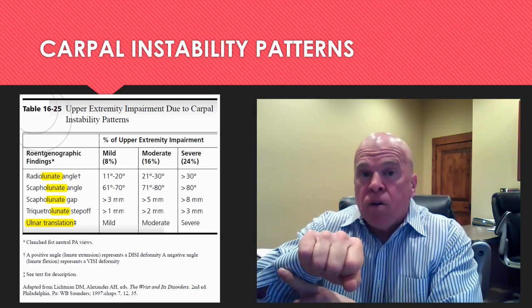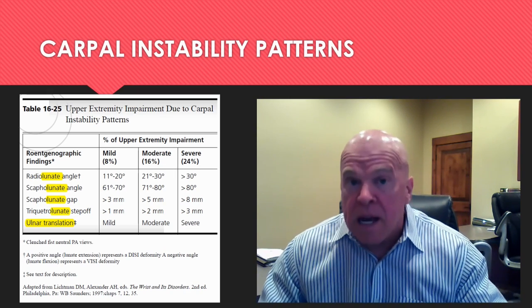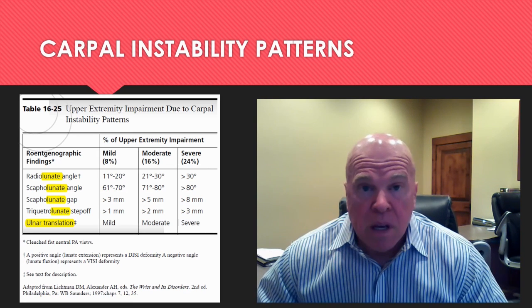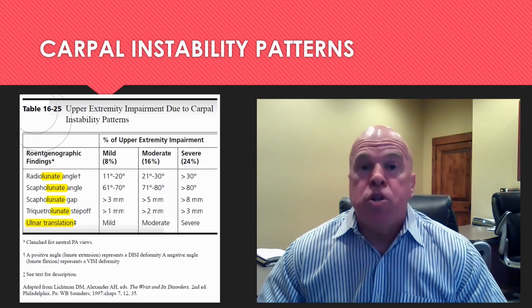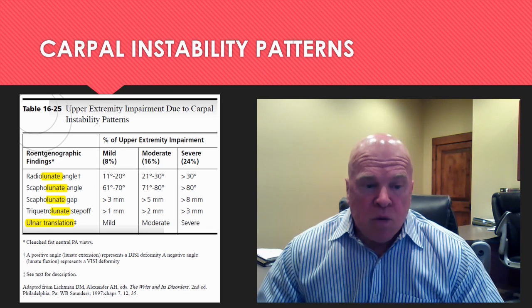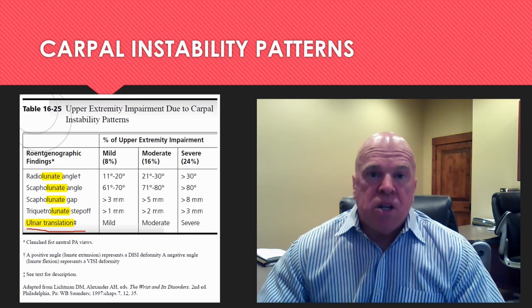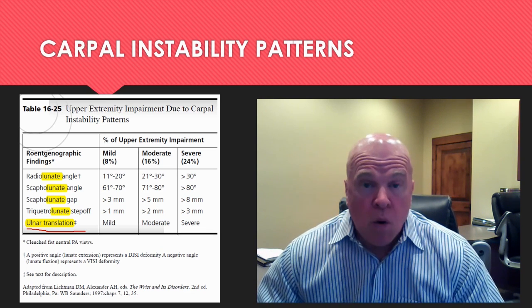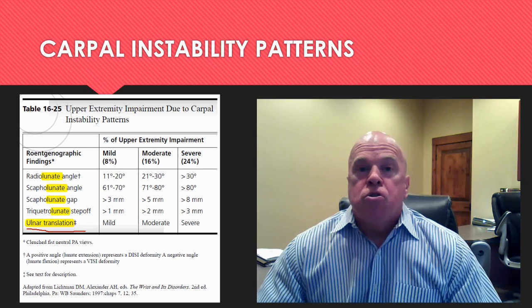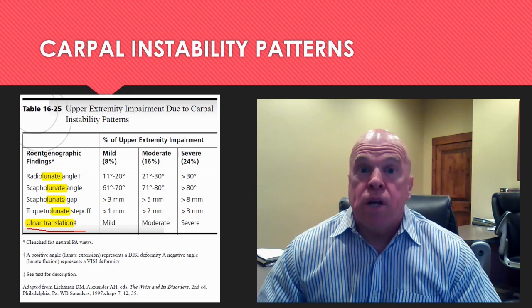I like the ulnar aspect of the hand elevated because it gives a look directly down the joint surfaces of the scapholunate articulation and also the lunotriquetral articulation. And then finally, the guides require that we assess for ulnar translation, and that can be done on the neutral P to A or the neutral A to P. Okay? So let's take a look at these particular angles and measurements.